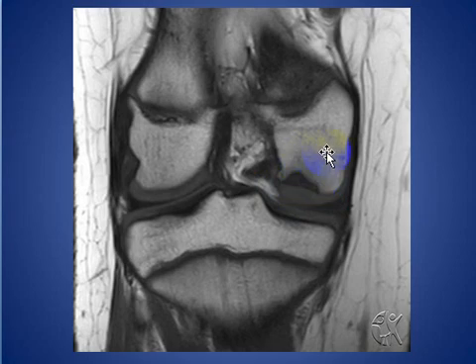If it is losing the bone, and in the T2 we see a fluid signal surrounding the region, this will become unstable and may be detached, resulting in a loose body.